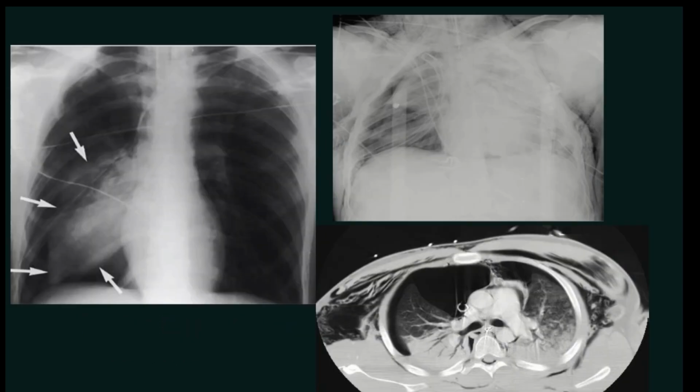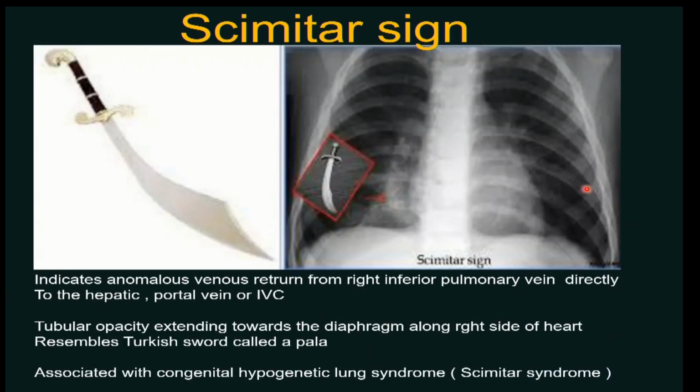In this fallen lung sign, the lung is just falling off the hilum, because as we know, the main bronchi hold the lung in position. So when the main bronchus is dissected or transected, the lung loses its support and is just lying by the side of the lateral chest wall or the diaphragm. This is the fallen lung sign, very helpful in cases of high speed road traffic accidents, and usually associated with pneumomediastinum, pneumothorax everywhere and subcutaneous emphysema.